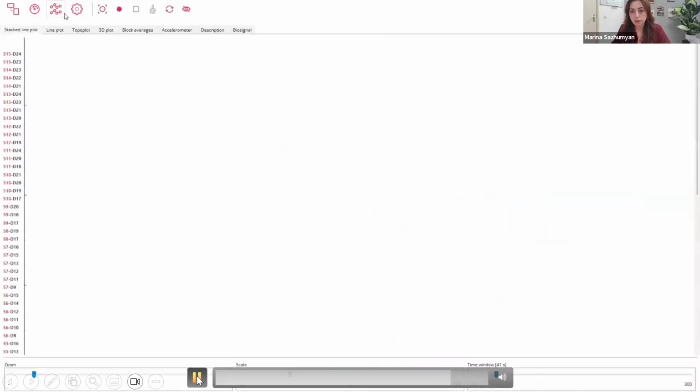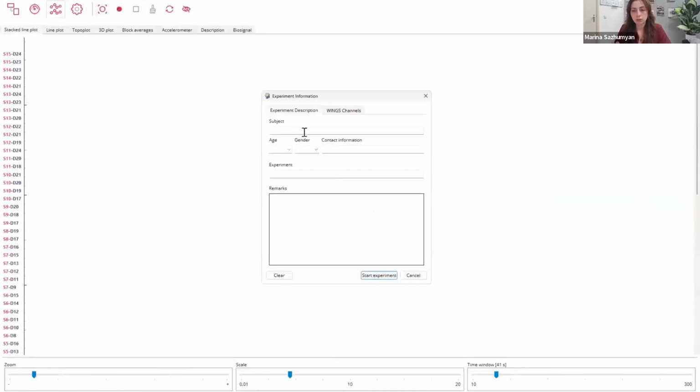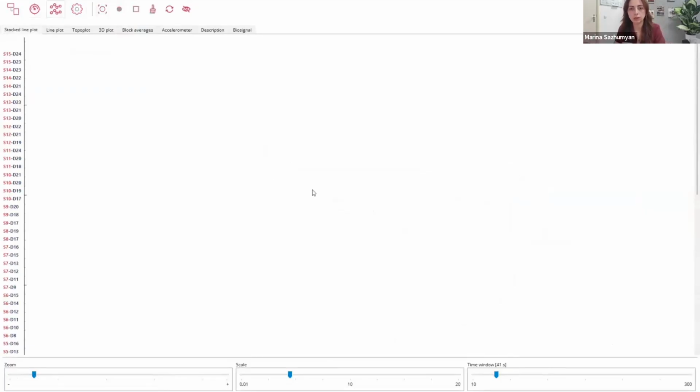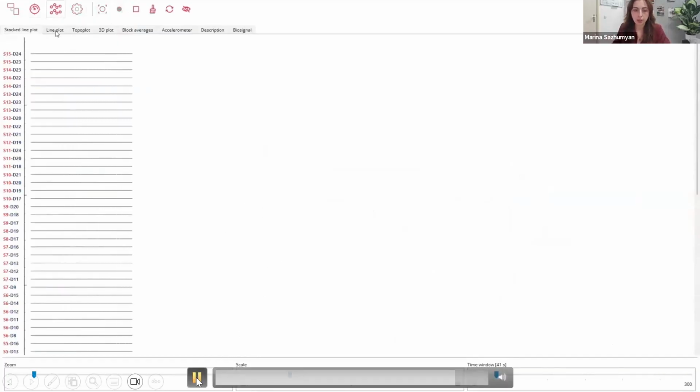Now, if you're not sure about your split ratio when creating your configuration, it's also a good idea to do the split, to define the configuration, go to your signal, check your signal quality, and then you can always go back and forth and modify your split ratio.